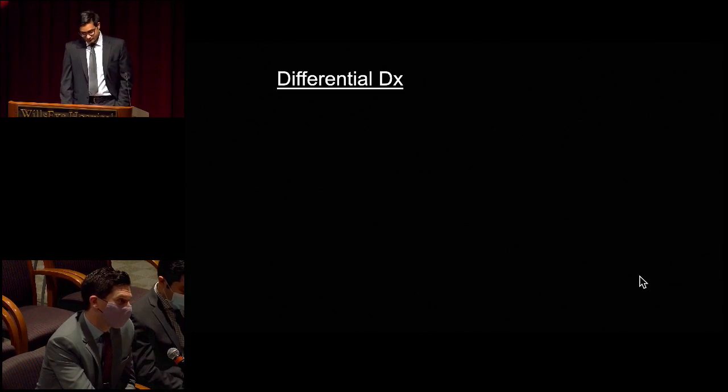So with the information that we have at this point, what kinds of things would you be thinking about for this patient? Yeah, so in the initial anterior segment exam, there was no note of at least anterior vitritis, but I think we're seeing that there's clearly some media opacity here. So I'm thinking that inflammatory and infectious lesions are top on my differential. Things that can cause focal intraretinal thickening and overlying vitritis, I'd be concerned about toxoplasmosis in particular. Sometimes viral retinitis can also look similar to this, though there isn't as much vascular leakage and vasculitis as I would expect.